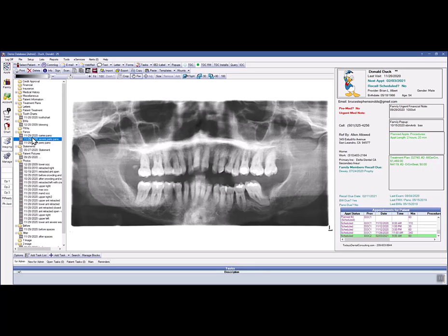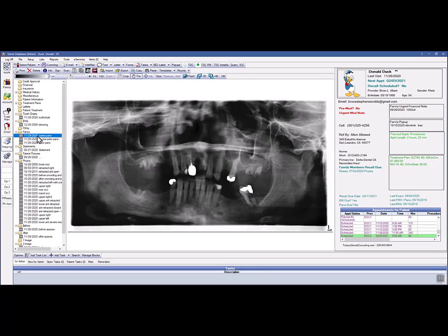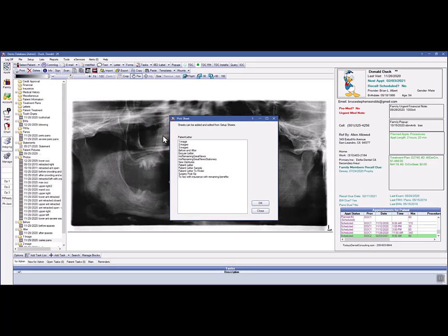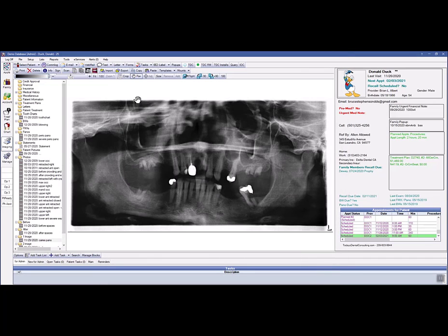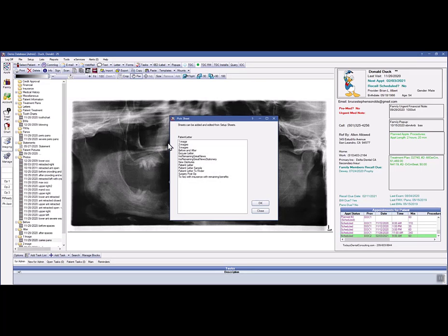So I'm going to drag it back up to the top because I want to use this other Panorex that I also use a lot. I'm going to put that down there in image 1 to show what happens. Little cavities always get bigger. And again, now I just click on that, click on one image. I can write notes down at the bottom. Patients can understand this, and particularly when you give it to them as a walkout, it has an impact.